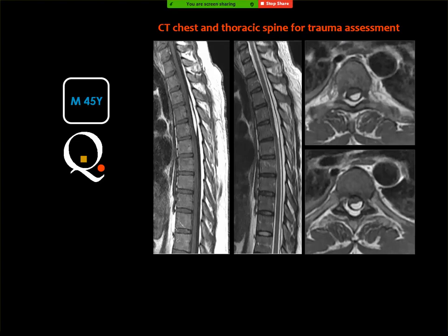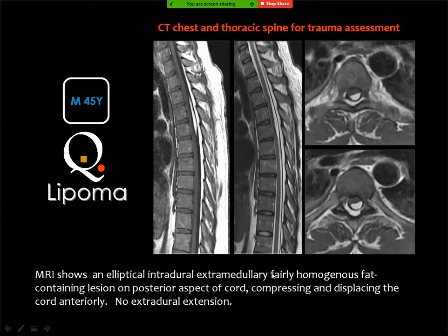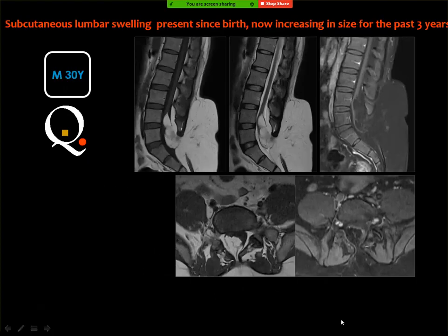Epidural hematoma. Okay, both possibilities are good, and there is a bright lesion in the T1 in the subdural space, and it is also bright in the T2 weighted image. Then both hematoma and lipoma can appear like this. And in order to differentiate between hematoma and lipoma, you should use fat suppression, and this was a case of lipoma. Okay, what do you think of this?